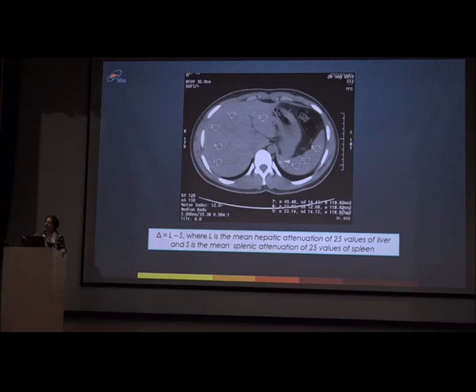Speak up. Why is liver brighter? Why is liver denser? Yeah, you tell me, Kavita. Why is the liver denser? What is the composition? What component of the liver makes it denser? You can pass on to the next one if you can't answer, or take help from your friends. What is it in the liver tissue that makes it darker or brighter, let's say more dense than spleen, which is why we always look at the spleen and liver?